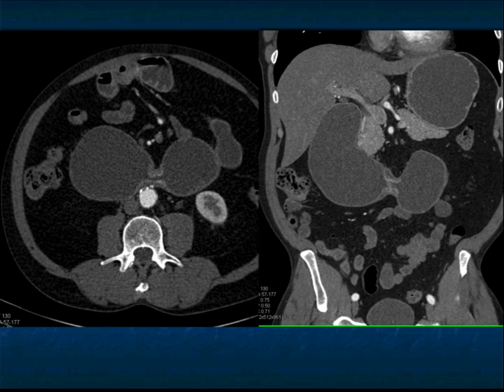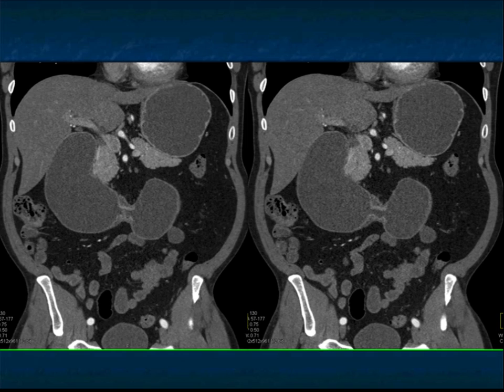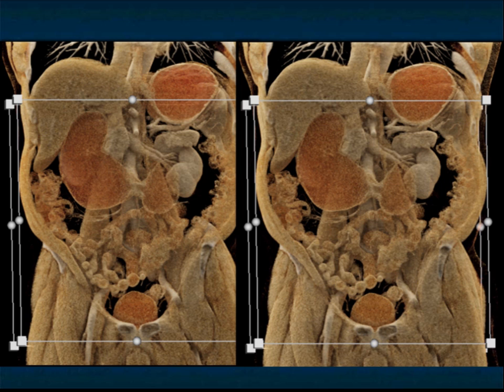And what you're seeing is a short segment of bowel that's narrowed and enhancing. It doesn't have the mass effect like malignancy, and this was inflammatory. And this was an unusual appearance of Crohn's disease. We can see Crohn's from the stomach to the proximal bowel, but unusual to see such a short segment causing such dilatation. So again, in your differential diagnosis of small bowel obstruction, be it proximal or distal, you're always going to think about Crohn's disease.